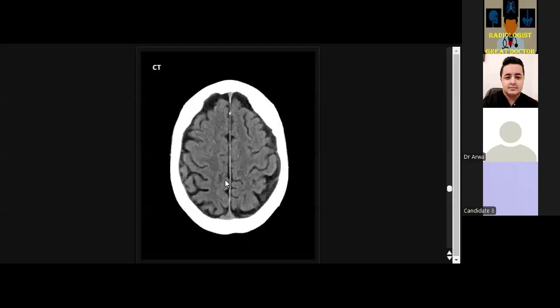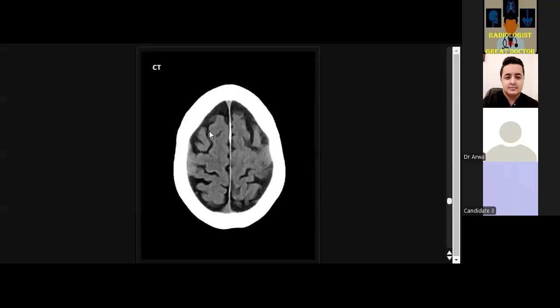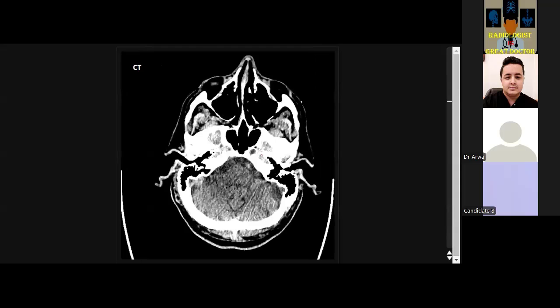Also, sir, this can be sarcoidosis. Dural thickening downward: sarcoid and TB cause dural thickening, but at the basal meninges, not high. High, and if associated with a mass, think of lymphoma or metastasis. Also, in the highest cuts, look for any subarachnoid hemorrhage, for example, or any diffuse axonal injury. Very good, boss. The next candidate in this group, I think the last one.